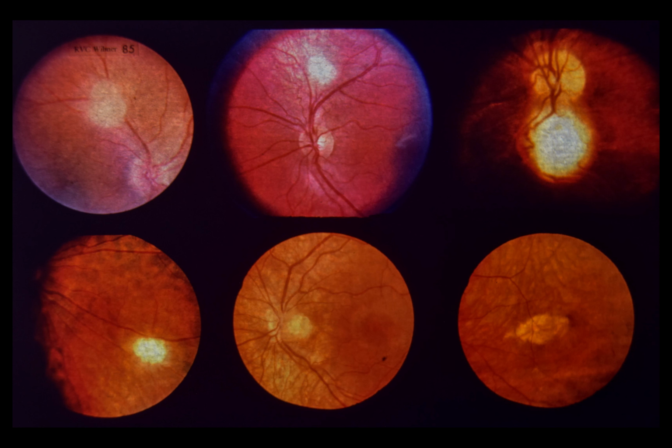Lower left. The peripheral lesions may eventually have a glistening, mulberry-shaped appearance, resembling the more common, smaller optic disc drusen. Lower center. Although generally found in the periphery, these lesions may also overlie the optic disc. Lower right. Patients with tuberous sclerosis may also have peripheral, hyper- and hypopigmented choroidal lesions. The etiology of these lesions is unknown. Recognition of these fundus lesions may enable the ophthalmologist to provide a specific diagnosis in children with idiopathic seizures, mental retardation, or both.